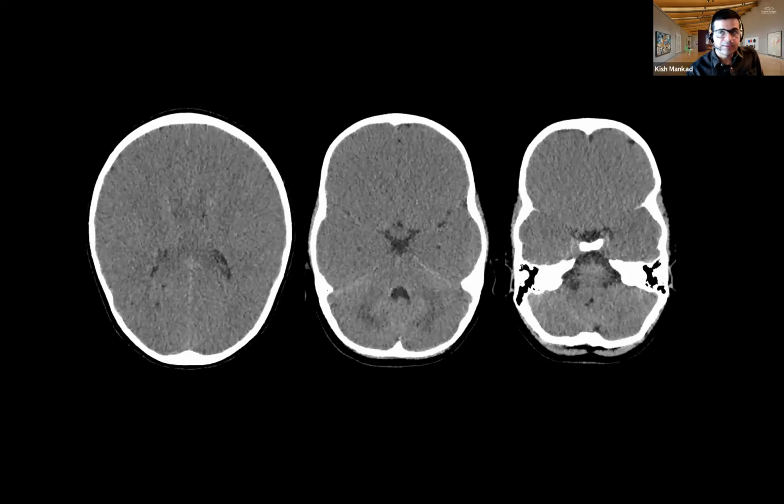But you can get situations like this, and here there wasn't a problem with the dose, but this is a very tight brain. It is so tight that you have effaced the ventricles, you have lost the gray-white differentiation. The patient was of Turkish origin, and you're beginning to see what looks like maybe some changes within the dentate nuclei around the cerebellum. You can see the dentate nuclei pretty much there. So the question is, what are we doing here?